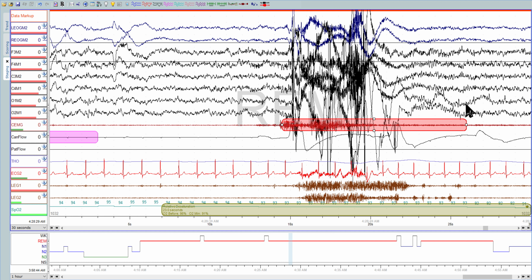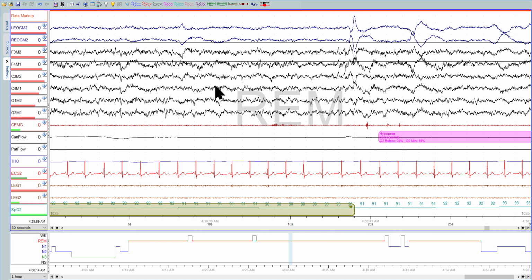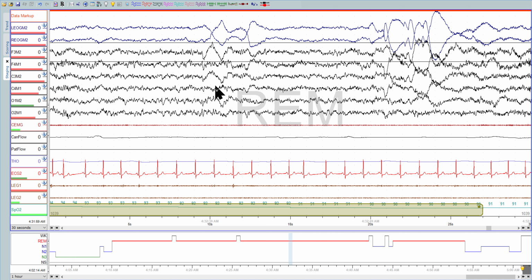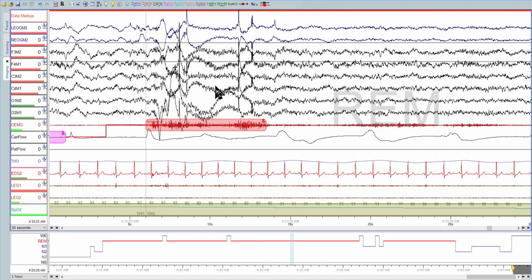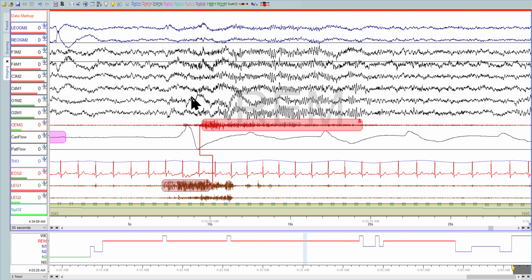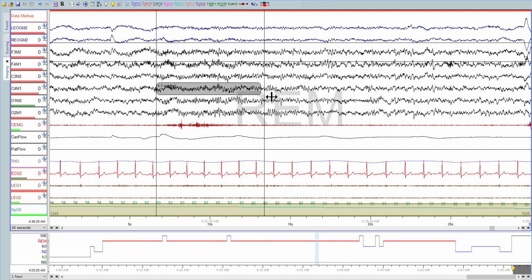And then all of that. Good arousal. Good arousal. One little arousal you missed there.